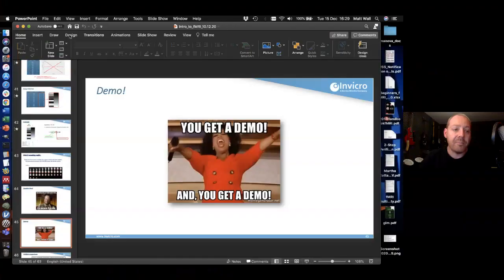Okay, thank you. So yeah, I'll let you get on with your slides. Okay, great. So the next bit is something which could be absolutely disastrous, because I'm intending to try and do a live demo of some analysis with FSL. So this could all go horribly wrong, but let's give it a go. Hopefully you can still see my screen and what I'm doing.